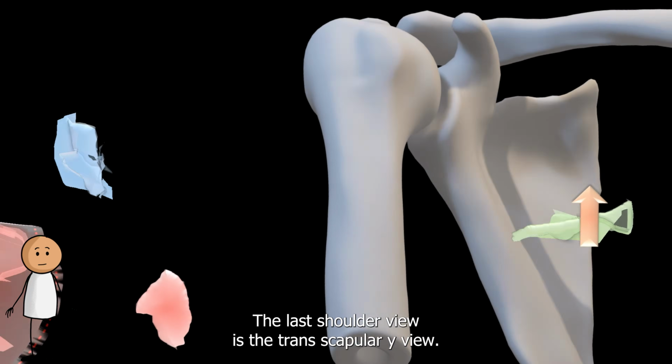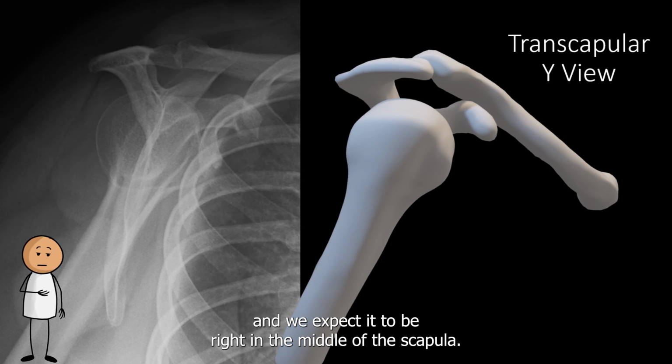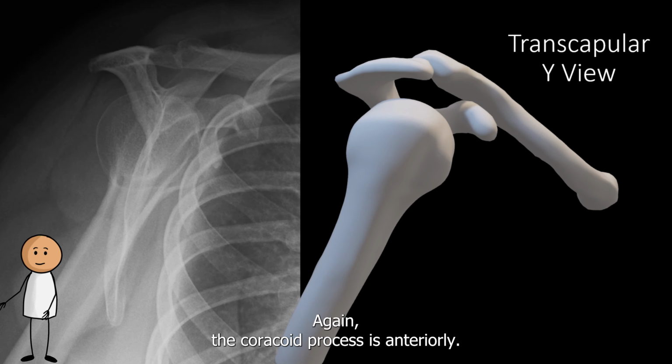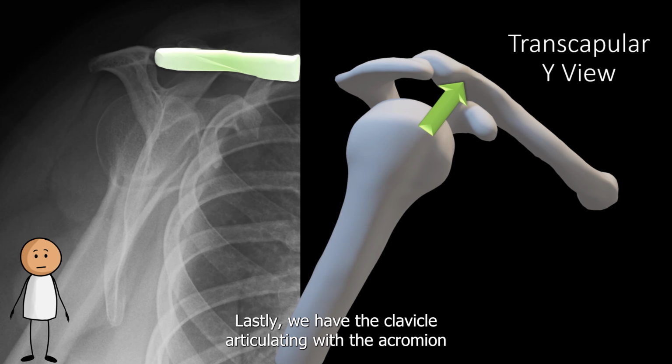The last shoulder view is the transscapular Y view. Here we shoot the X-ray beam through the humeral head, and we expect it to be right in the middle of the scapula. We usually get this view when the axillary view is hard to obtain. Again, the coracoid process is anteriorly, the acromion is posteriorly, serving as the roof of the humeral head. Lastly, we have the clavicle articulating with the acromion.